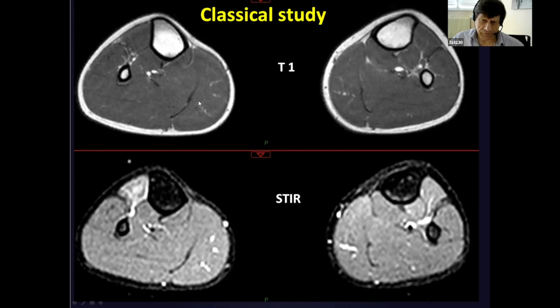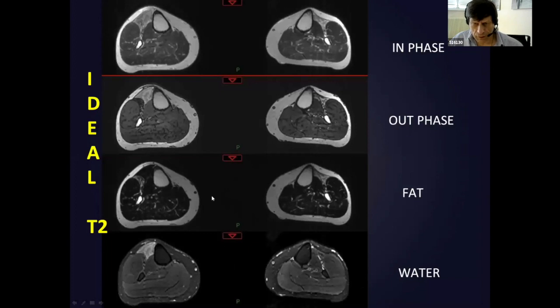These slides are performed at the same level, and this patient has FSHD disease in an early stage of inflammation of the tibialis anterior, previous to fatty infiltration. Another patient with facioscapulohumeral dystrophy, but in a late stage.